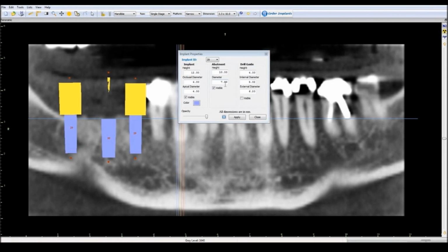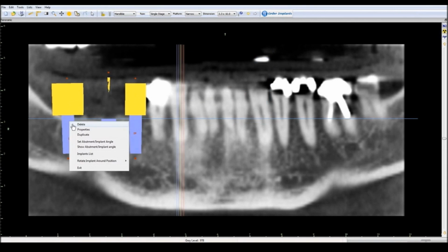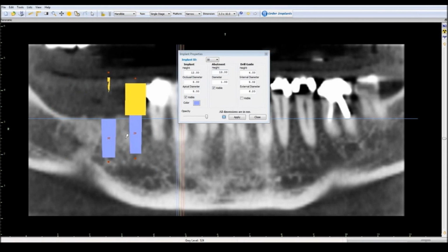Now this next tooth is going to be a molar, and again, restorative-driven. I now declare that molar to be 10 millimeters. Now if I bring this molar in contact or approximate to the second bicuspid implant abutment, the spacing between these two implants will be precise because each implant is centered on the future tooth. If there were a second molar here, the process would be repeated.